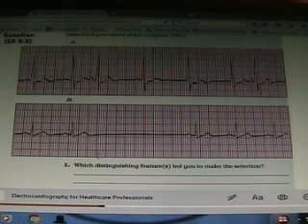No. It's not asystole. Asystole would be what? The whole 6 seconds. Flat. And remember, the book and also my exams will only show 6 seconds at a time. So if you see that, that's not 6 seconds. So that is what? That's a pause. Right? That's correct. That was a sinus pause. So B is a sinus pause.